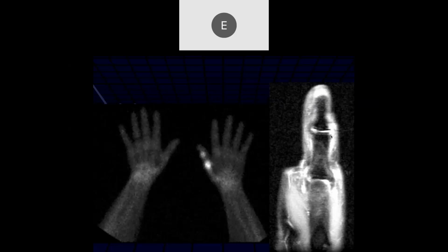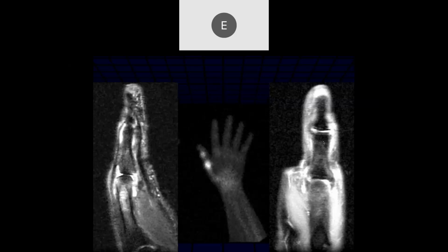Yeah, edema and thickening of the capsule. Same on the IP joint. Here are the sagittal images. This is a PD fat sat. Looks like effusions in those joint spaces. A little bit of edema within that first metacarpal head, maybe in the proximal phalanx there. Okay.